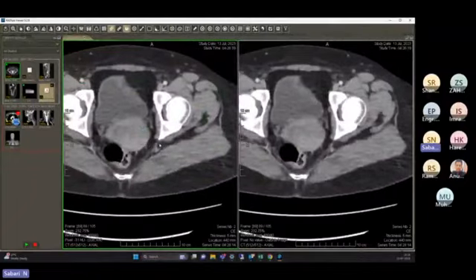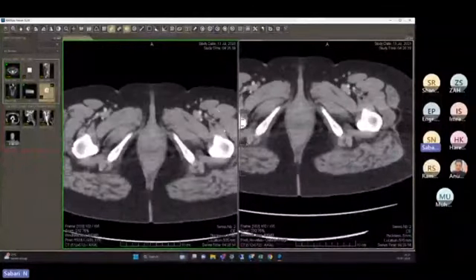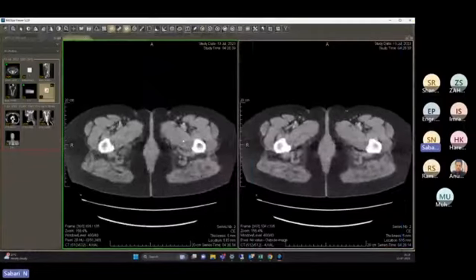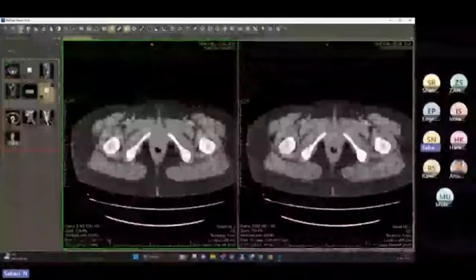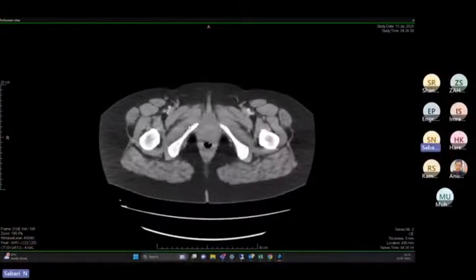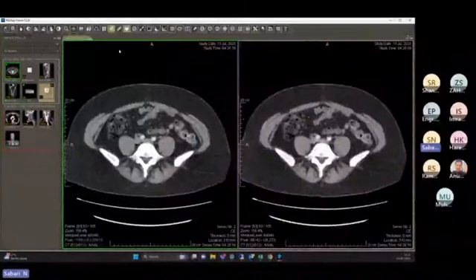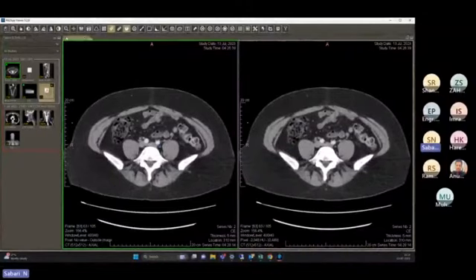Because sometimes what happens is, when the radiologists are scrolling the images, they feel only half of the images are here. Okay, I'll make this a bigger window, smaller one. They will feel it is only half of the window, that the images are captured only like that, or the application is hiding the remaining images. So when the pan option is there, you can move the images in the clear window and see whether the scan was done like this, or the images are being hidden by the application. So it will be helpful for the radiologist. Pan is just for moving the images around, left to right or right to left, within the screen.